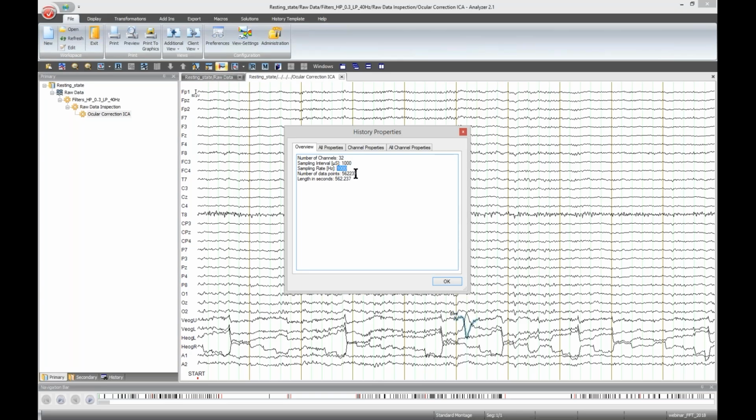So with a sampling rate of 1000 Hertz, it's not that easy to adjust the segment length to make it a power of 2. Of course, unless we create a fractional segment length, for example, a 1.024 second segment to get 1024 data points. But it's not that necessary to create fractional segments because it has a consequence which leads us to zero padding. So it is preferred to manipulate rather the sampling rate. So let's start adjusting the sampling rate.